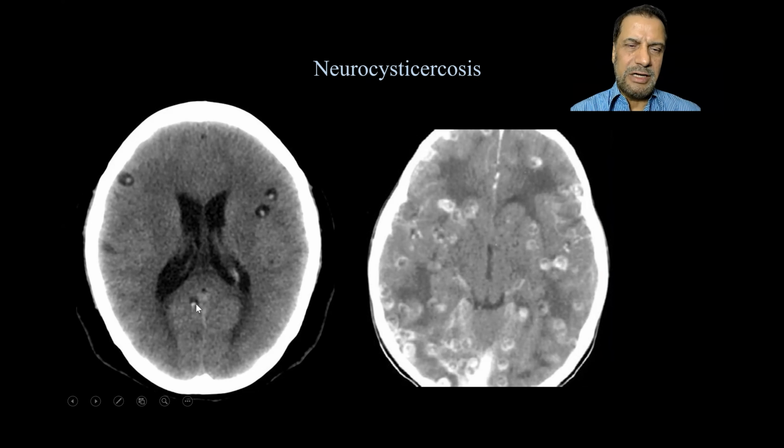So these are living cysts, punched out living cysts like this. Looks like a Swiss cheese. Not a good name for a nice food. And then you can see so many multiple cysts with enhancement, and some are active. So this is active. There's edema around it.